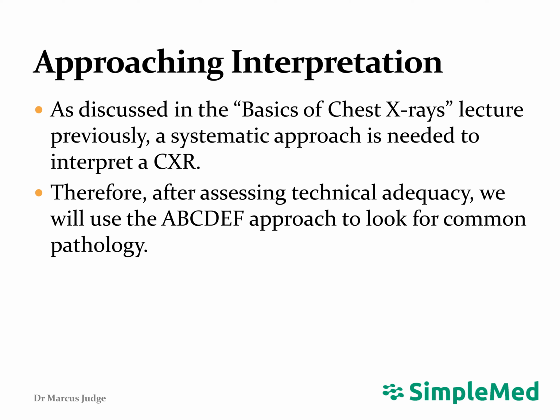We have previously outlined a simple, systematic approach to chest X-ray interpretation in our Basics of Chest X-rays lecture using the ABCDEF mnemonic. It is important to have a structured approach in order to not miss pathology or fall prey to finder's bias, whereby you may stop looking for further pathologies after finding a single one.